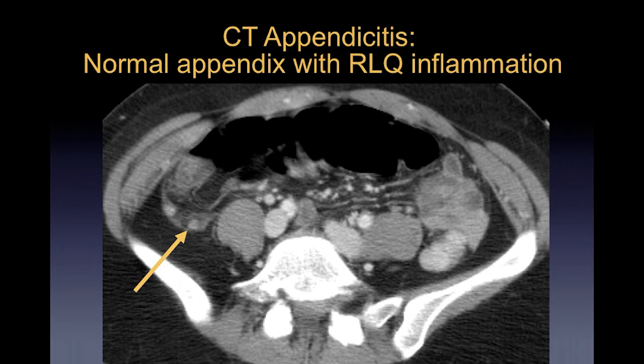And the scan was done. Is it appendicitis? 25% chance. There was no physical exam to go along with it. The patient was rescanned, I think the next day or some hours later. The fluid and inflammation had resolved. So I don't have an explanation for it here, but this is one of those 75% of cases that turn out not to be appendicitis.